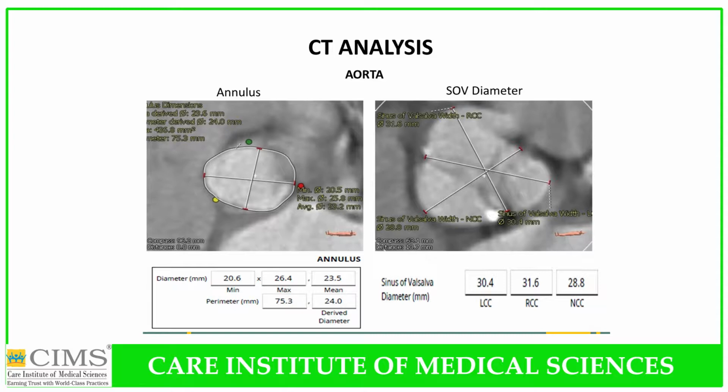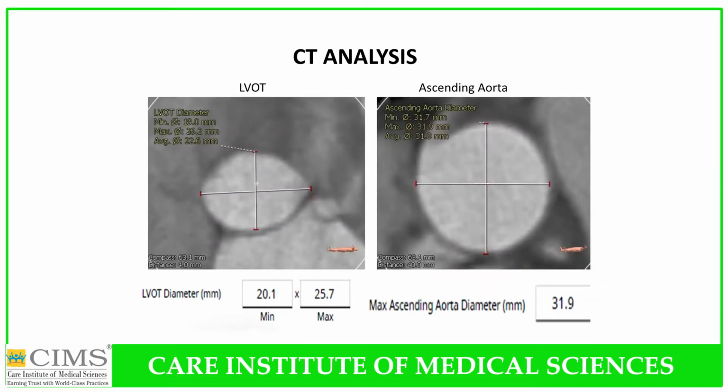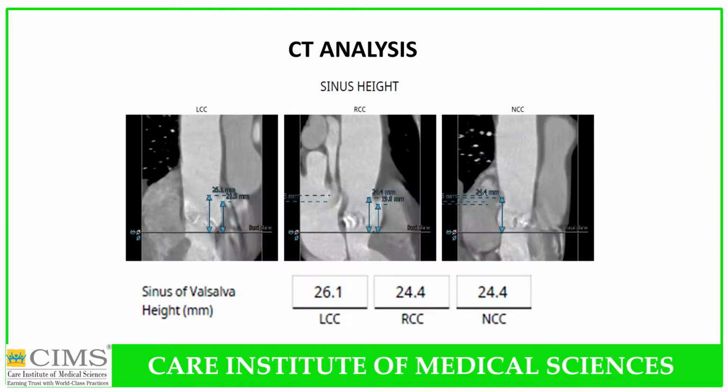This showed fairly dilated sinus of Valsalva diameter. Sinotubular junction diameter was 20.5 by 26.9. Aortic valve calcification was mild to moderate, very appropriate for TAVI procedure. LVOT diameter again was 20.1 by 25.7, minimum and maximum diameter, and maximum ascending aorta diameter was 31.9.